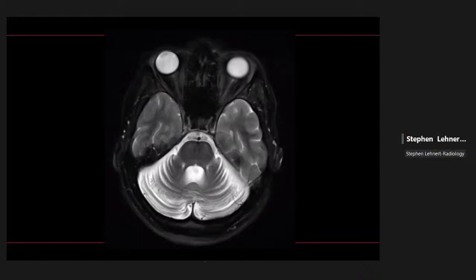So I see, compared to at least the temporal horns, the cerebellum is quite atrophic. Definitely. So markedly atrophic cerebellum. Why am I showing you this in the setting of an epilepsy lecture? Because this is, I think, very commonly seen with chronic epilepsy medications. Yes, absolutely. And in fact, not only do epilepsy medications cause cerebellar atrophy, but epilepsy itself, even patients who are not well controlled with medications or who have not been on chronic medications, can have some degree of cerebellar atrophy.